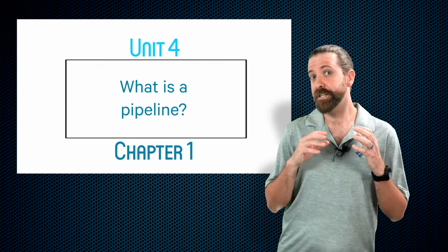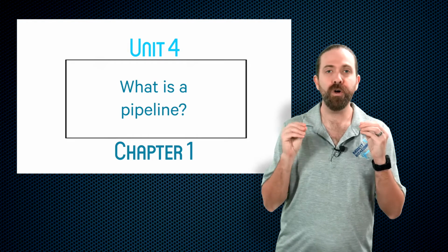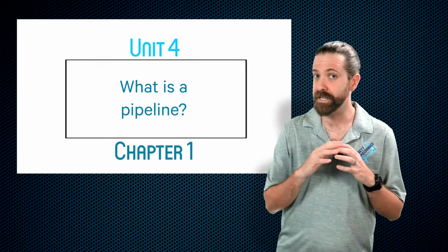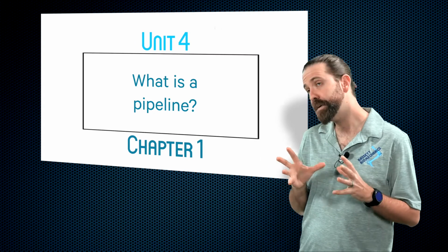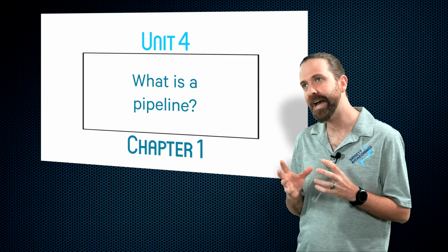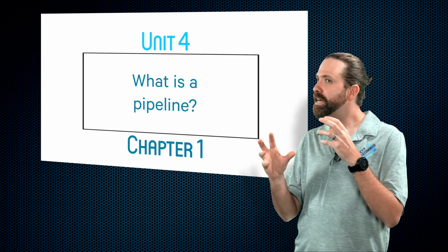If, however, this really is the first time you work with pipelines, do not be afraid. This tutorial will take you from zero to actually creating your very first pipeline to automate your entire data processing in Visual 3D. Although it may appear this way at first glance, making a pipeline isn't so much like programming. More accurately, it is scripting, which means it's kind of like programming, but made quite a bit simpler.